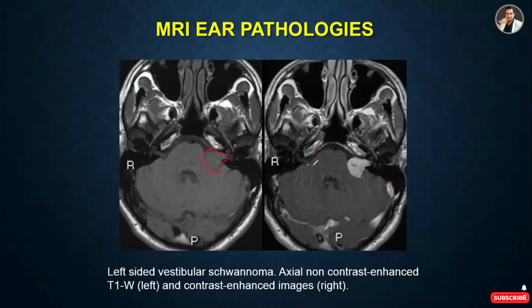When we put the contrast, we can see that the lesion is enhanced. This is the tumor. This is the tumor.